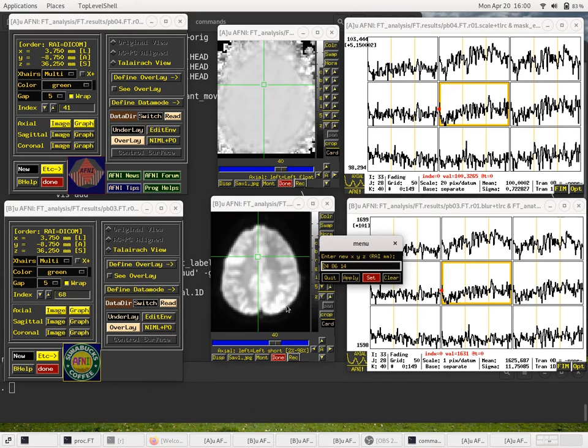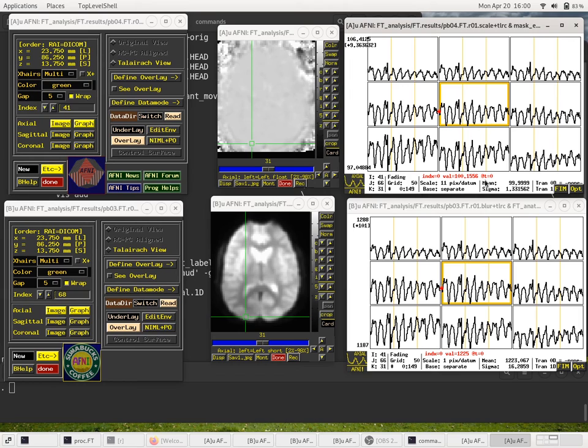So let's jump back. But now compare the shape of the curve, the shape before and after. It's basically identical. There's no difference between the time series shapes before and after on the bottom and on the top. What changed is the scaling of them. Now you can see this is 1187 up to 1288, and this is 97 up to 106.